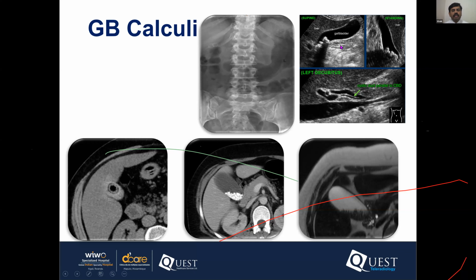And please make sure that when we do ultrasound, we tell the patient to be on overnight fasting on a low-fat diet, which will make the setting more favorable to look for a gallstone. Gallstones on ultrasound are seen as always hyperechoic nodular components within the lumen of the gallbladder. These can be single, multiple, and of small size or large size.